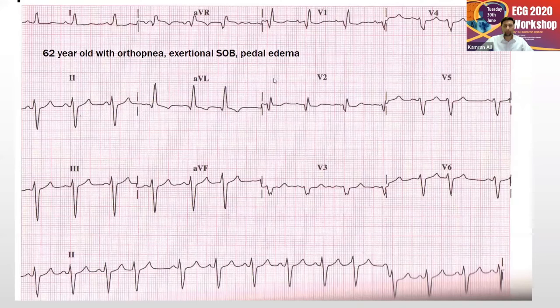All right. So it's definitely a sinus rhythm, okay? And if you want to decipher this, you can see that there is a wide complex here. So you would say normal sinus rhythm, right bundle branch block, and look at the axis. Lead 1 is positive and AVF is negative. So it's a left axis deviation. So this is a bifascicular block.